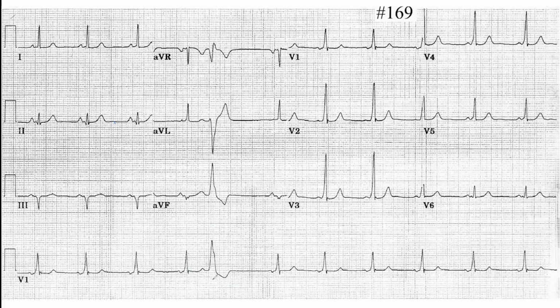Ventricular escape beat. Why? Because it came later? Escape comes later. Premature comes earlier. So it's premature. Now that's a premature ventricular beat. It's okay, it's fine.